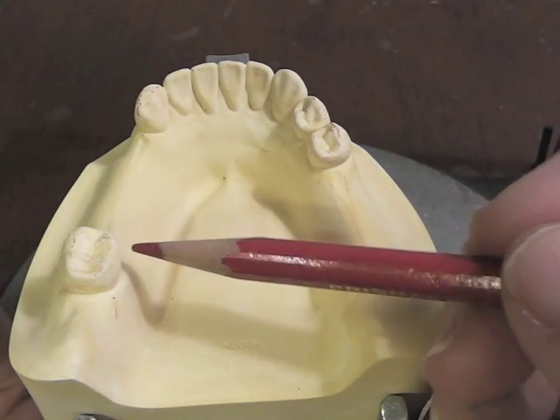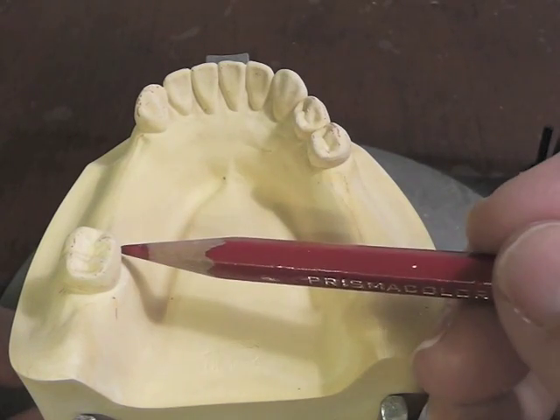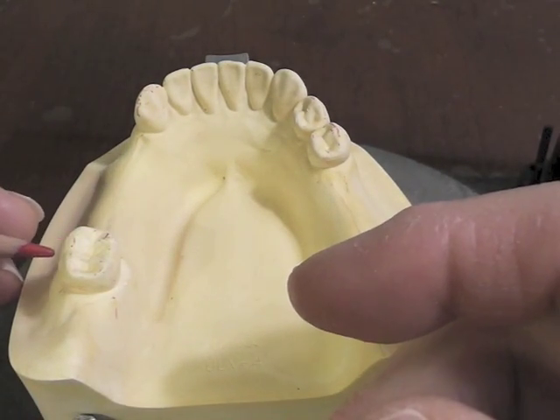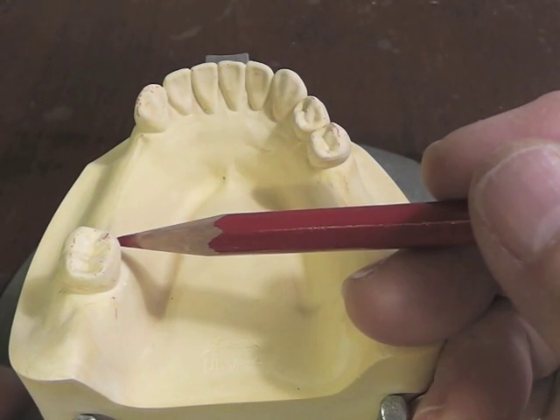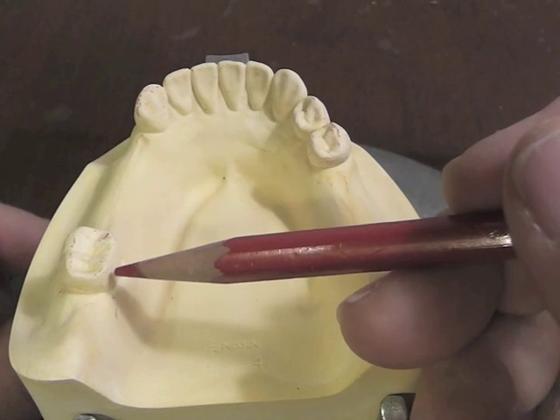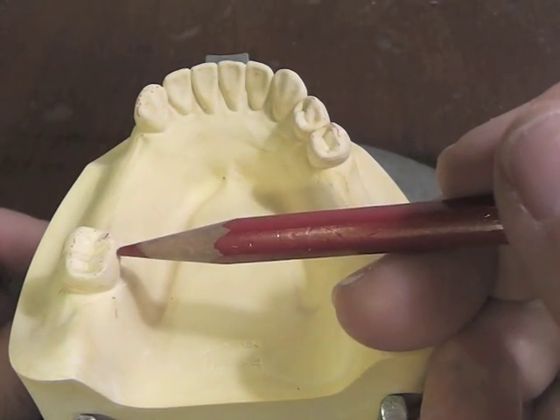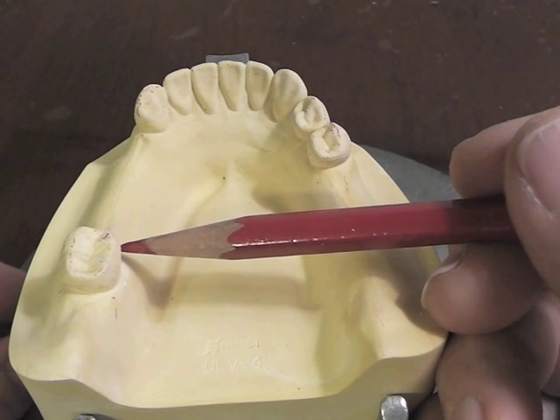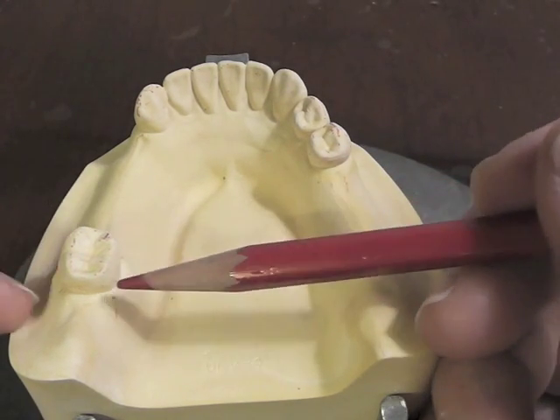But we have another idea. We can use that surface there as our direct retention surface. And the way we can use that is that we can put a rest here, do a reciprocal component on this side, do a distal rest, and bring our arm to the mesiolingual. By doing that, we don't have to reduce this tooth quite as much in this area to get that direct retainer above the survey line in its first 2/3. So if we pick a tooth in the posterior and we pick the worst undercut, that should probably be the one we should consider for our direct retainer, so that we don't have to mutilate that surface that much if we tried to go in the opposite direction.